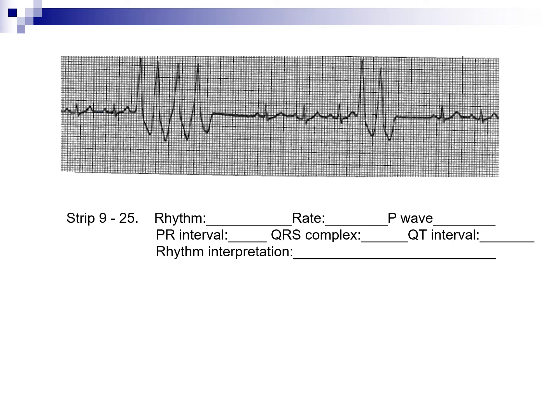So when we talk about P waves, we have P waves for our basic intrinsic rhythm. We do not have any P waves in the V-tach, obviously. So we can do a PR for our basic rhythm. So that PR is 0.14 to 0.16. The QRS of the patient's basic is 0.06 to 0.08. In the V-tach, that is a 0.12. So these are wider, so they're about 0.12 as well. So we know that they're wide. They're coming from the ventricle.